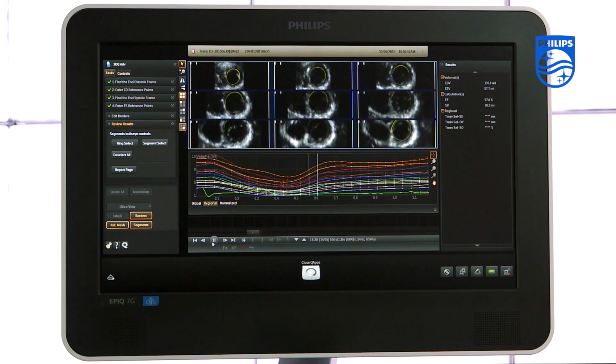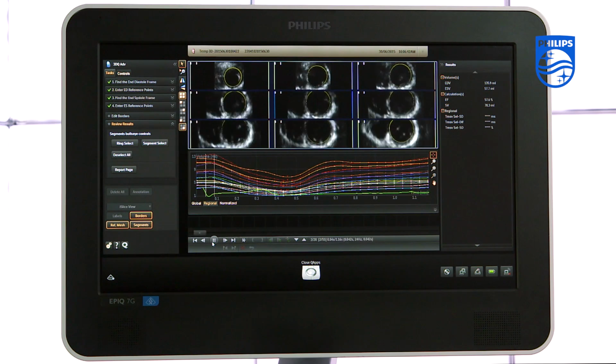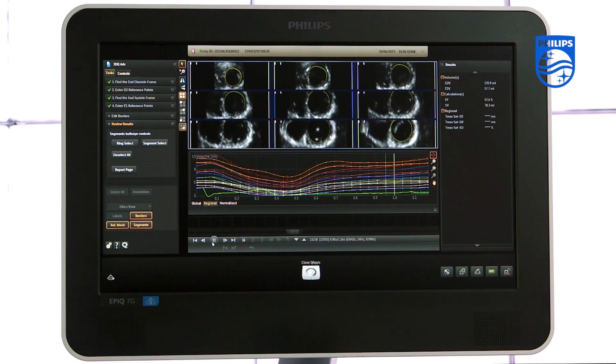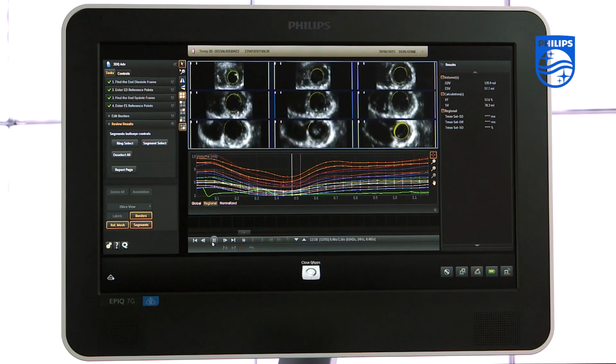The iSlice view presents the data as a series of slices similar to cardiac CT slice view. You can manage the number of slices shown, the thickness of the slices, and the range of image data included in the slices.